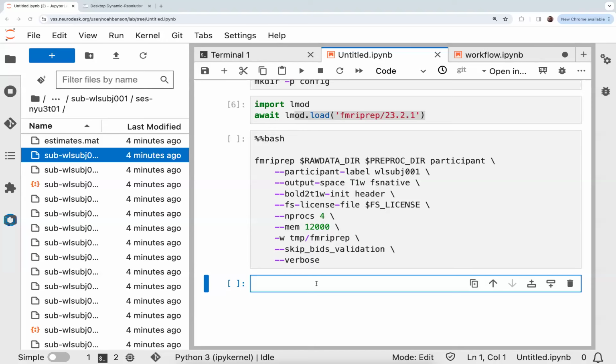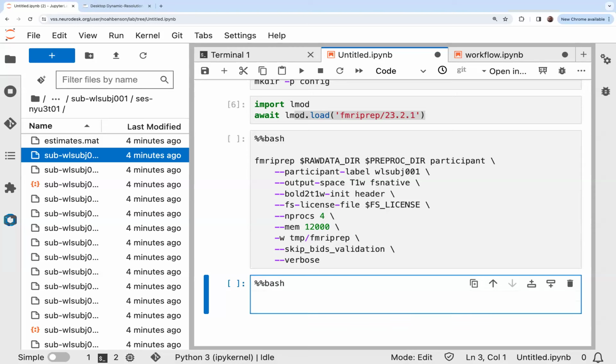Okay. In order to run this tool, we first need to install it. Normally I would have you do this in a Conda environment, but we didn't really have time to do that. So we're just going to install it locally in the notebook, and just know that next time you come back to this instance, this won't still be installed. You'd have to rerun this cell.